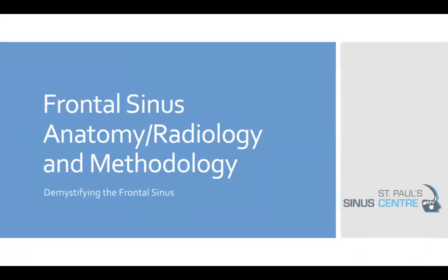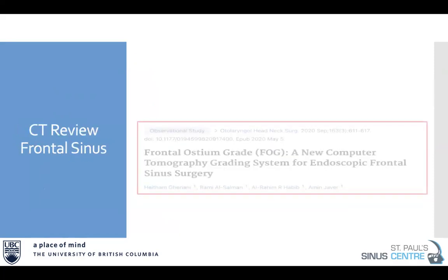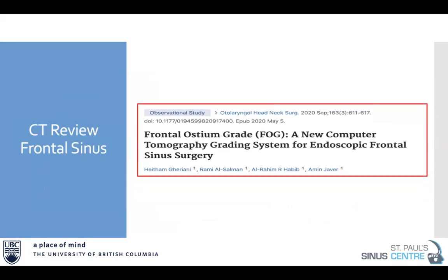So I just want to spend about 5 or 10 minutes on the frontal sinus, because we talked about this quickly, and this is really the most important part of your surgery. As we say, the pre-op CT review is critical. Image-guided surgery should happen up here. And if you've really reviewed your CT scan, you won't really need your image-guided system. We've published a paper on this for those of you who want to read it. It's an excellent paper talking about this.